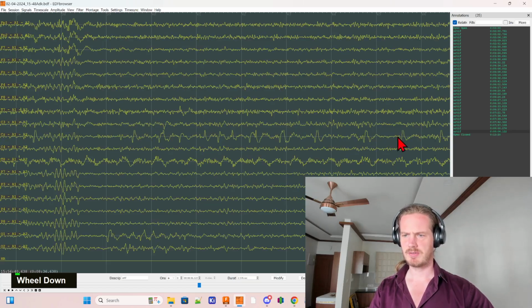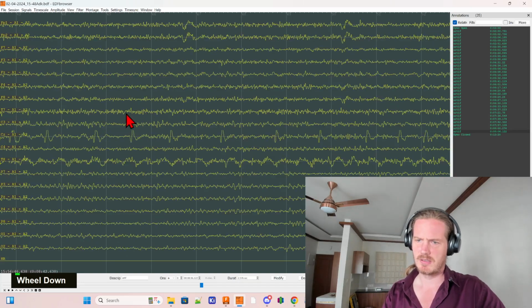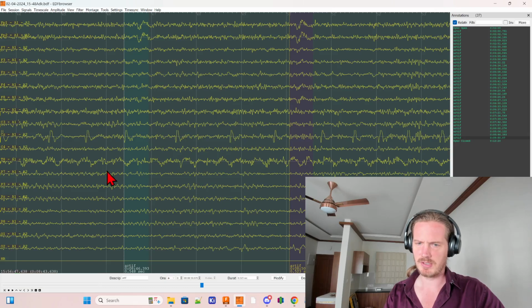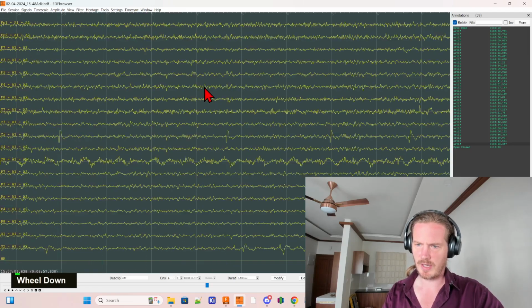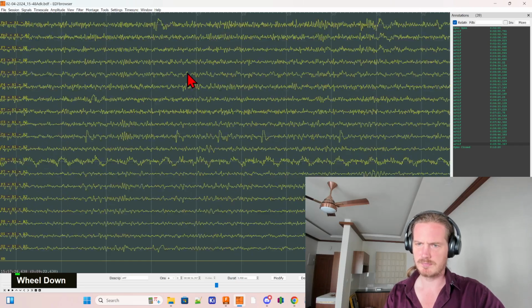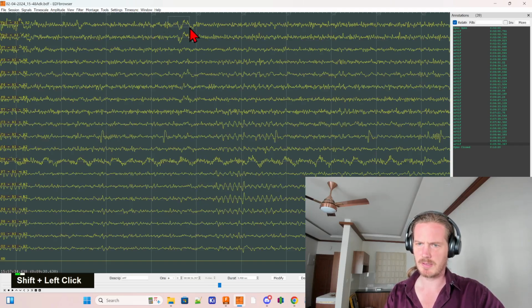On CZ, we're having this interesting phenomenon here. In CZ, there's definitely nothing that can. There's no eyeballs near to CZ, so I don't know what is causing these interesting pulses here, especially because we don't see them in any other location. And so I'm going to leave them because I have no reasonable explanation why they are noise. Little eye blink.